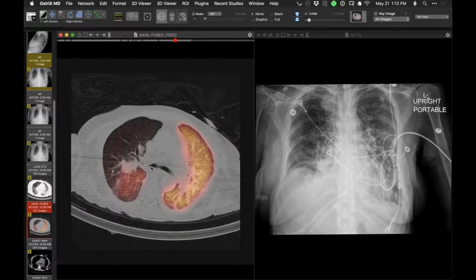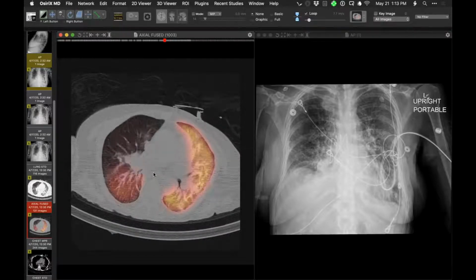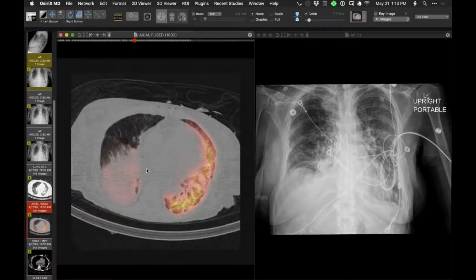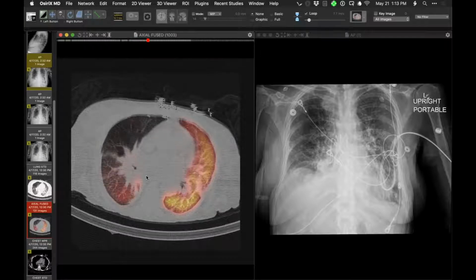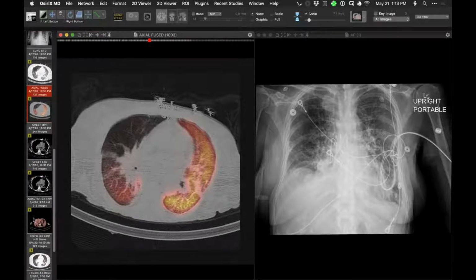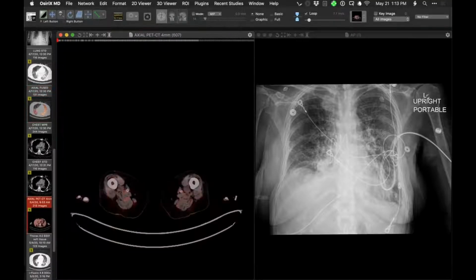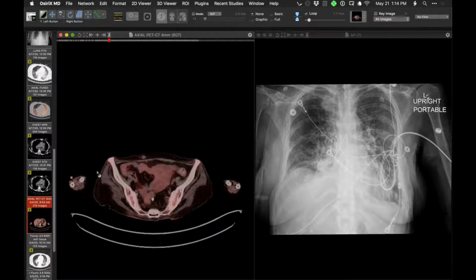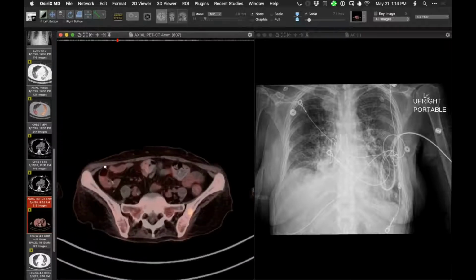But what you can see here is what was diagnosed in part, which was progressive narrowing of airways, particularly involving bronchus intermedius with associated atelectasis, involving portions of the right middle lobe and the right lower lobe with the expected findings of abnormal ventilation and perfusion on that scan. And then I'm not entirely sure why, but a PET CT was done in May, and it showed a bunch of things. So let me make this a bit bigger.